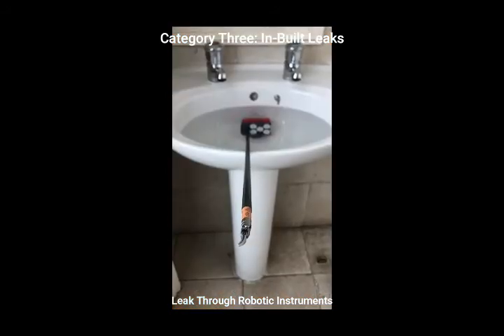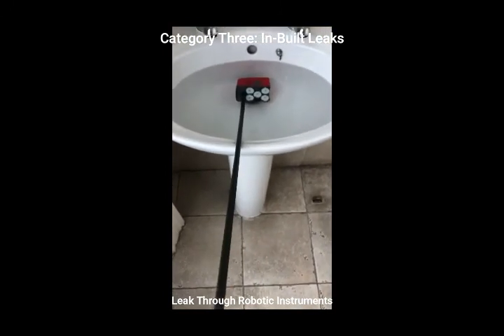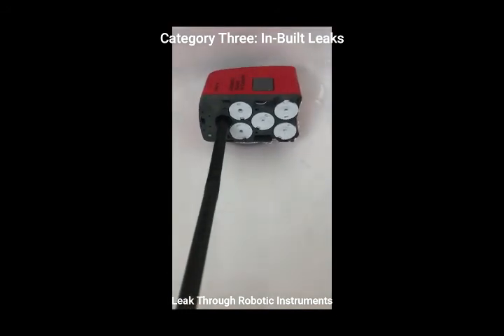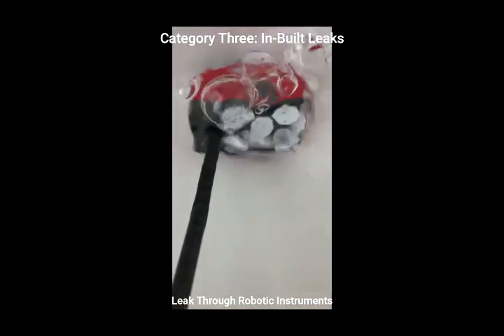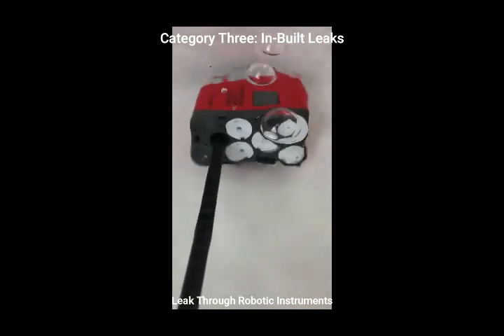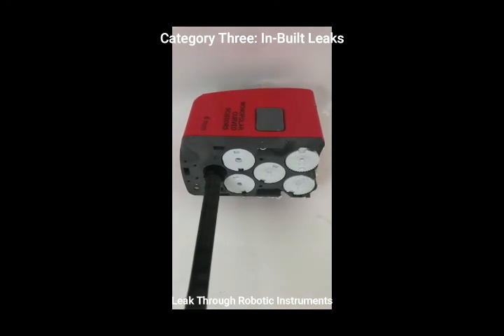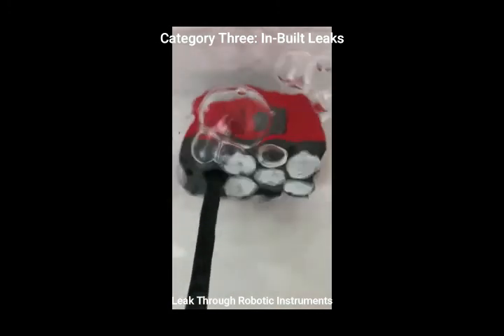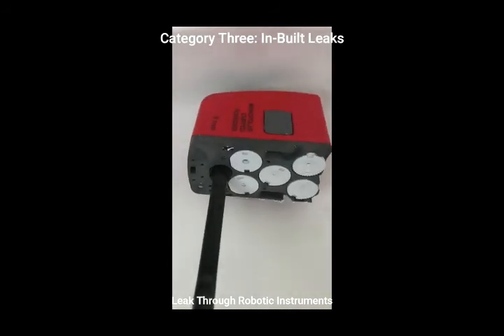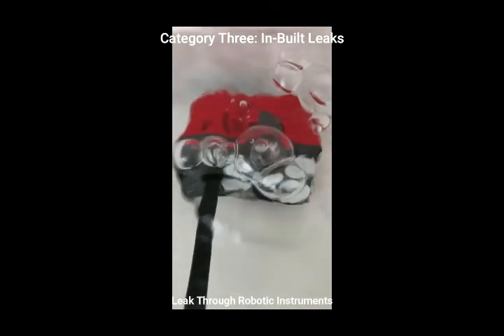To see better where it's leaking from, here the instrument head is submerged in water, and again a positive pressure is applied to the instrument tip. There are several areas of leakage, some of which are sites of attachment into the robot, although these are not intended to be hermetic seals. It's clear that leakage cannot be obviated by optimum current technique alone.